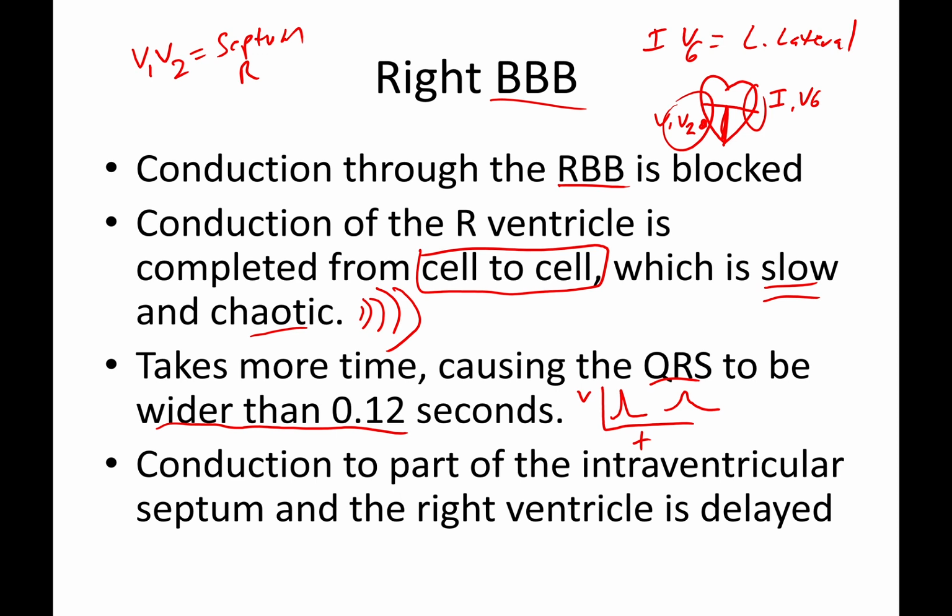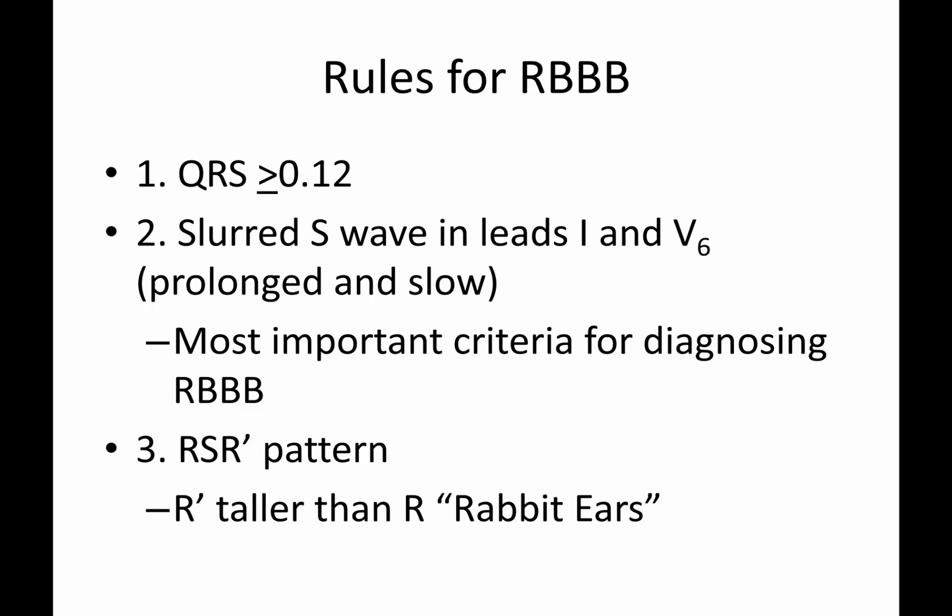The reason this makes sense is because conduction on that right side is thrown off. Even at that distant view from the left lateral side, it's directly across from it. So it will do one of the best jobs of recognizing that something's going wrong on that far side. And I'll have a picture for you to help put that together.